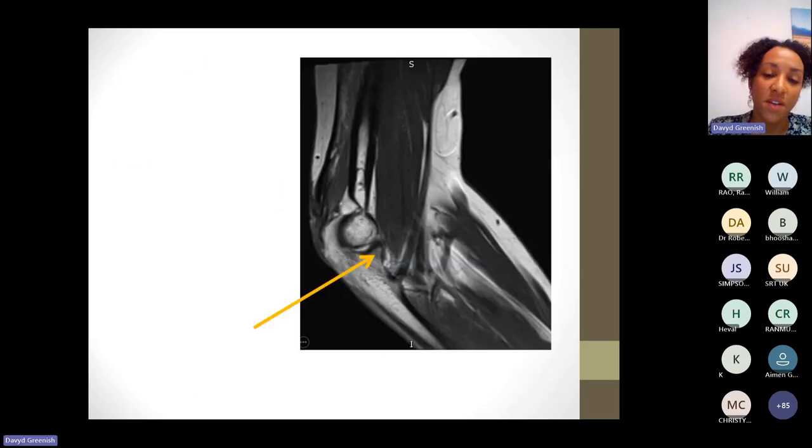Okay, so another tip is when they're pointing at a specific part of the bone, make sure you are labeling it as that specific part of the bone. This is an MRI, so we can orientate ourselves knowing that this is muscle, black linear structures, tendon, and then we've got bone because we've got a nice black cortex around the bone.